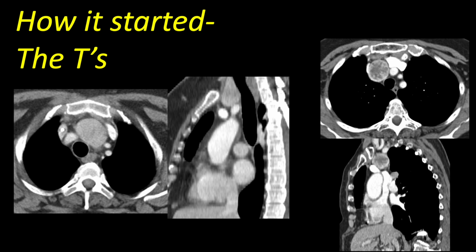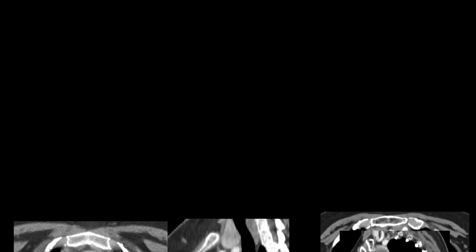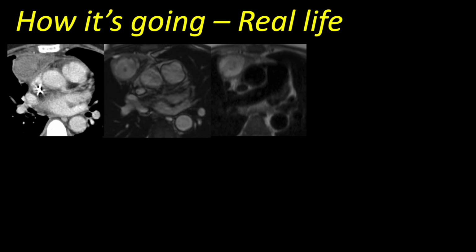But I don't like thyroid goiter in the anterior mediastinum because almost all of them are middle or posterior mediastinal, just like these two. These are both posterior to the brachiocephalic vein. They're not anterior mediastinal masses. They're middle mediastinal masses. So typically I don't think of them in the anterior mediastinum, although we do occasionally see them there. The compartments of the anterior mediastinum as defined by ITMIG really don't allow for a whole lot of thyroid goiters.